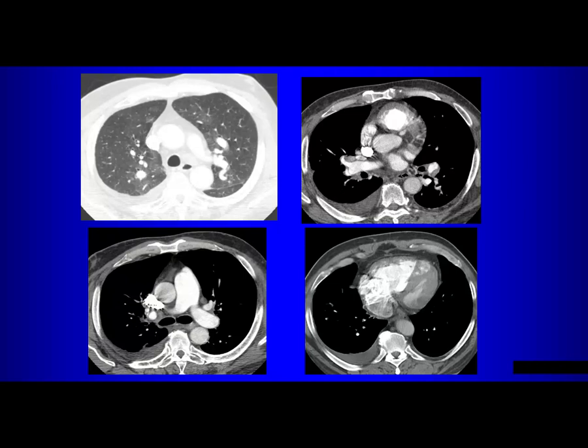Large right ventricle. So what else about the right ventricle? Also, the interventricular septum bows a little bit toward the left ventricle. What else about the right ventricle? Myocardial hypertrophy. So the right ventricle is dilated. By the way, what about the right atrium? It's also dilated, right? So you have enlargement of the right ventricle with right ventricular hypertrophy.